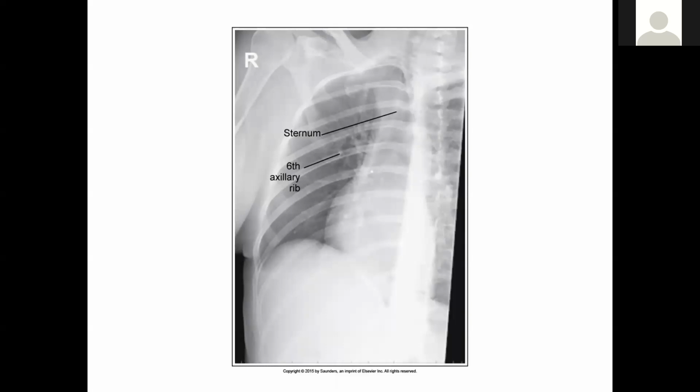Another elongated right ribs. This one, collimation could be improved a bit. We don't need the left side, but we also don't want to clip. So you're giving yourself a little bit of wiggle room here by having the light pass the spinous process.